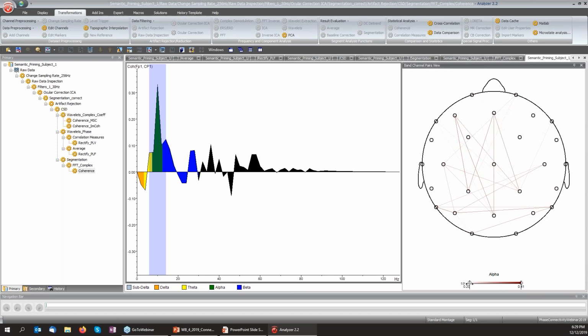And white edges on a white background here disappear. So then with that, I can visually introduce a threshold on the connectivity value on the imaginary part of coherence to only show those connections that have at least some that cross this threshold. And here we see that there might be some frontal posterior network that shows higher connectivity values.